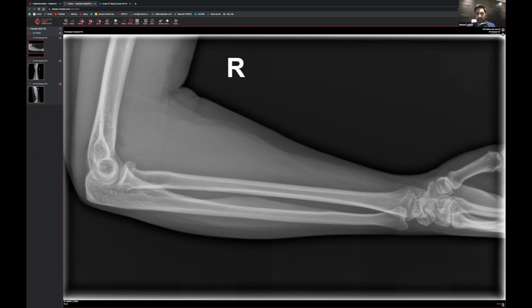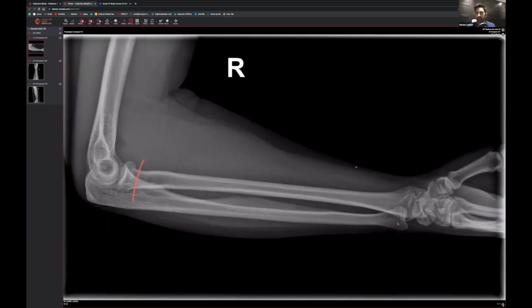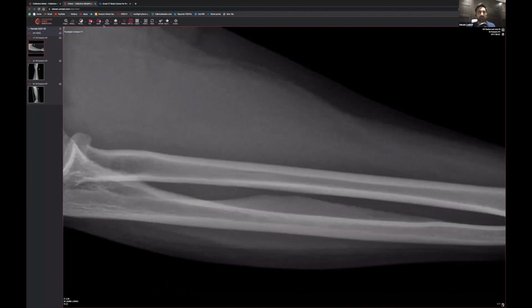So that's just a silly way to try and remember which one you're looking at if you are at this point. If you're at this point or you are at this point. So then what you do is just try and make sure there's no sort of discrepancy, no linear deformity or any sort of buckle, tail, anything like that going along the actual bones. And the way you do that is really genuinely to zoom in and just follow along.